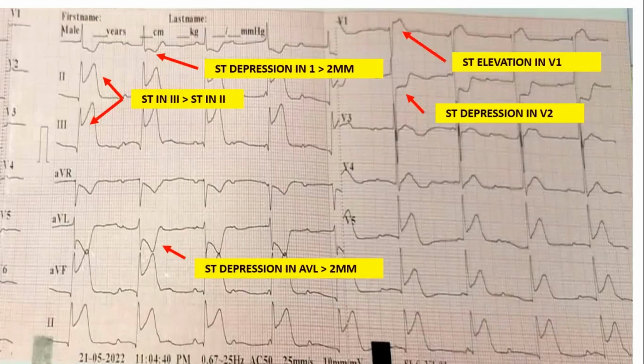These 5 findings, although they are very obvious, don't miss them, because definitely this might cut your marks. He might be expecting, because he might ask some other questions linked to management. So always in the case of MI, pick up everything.